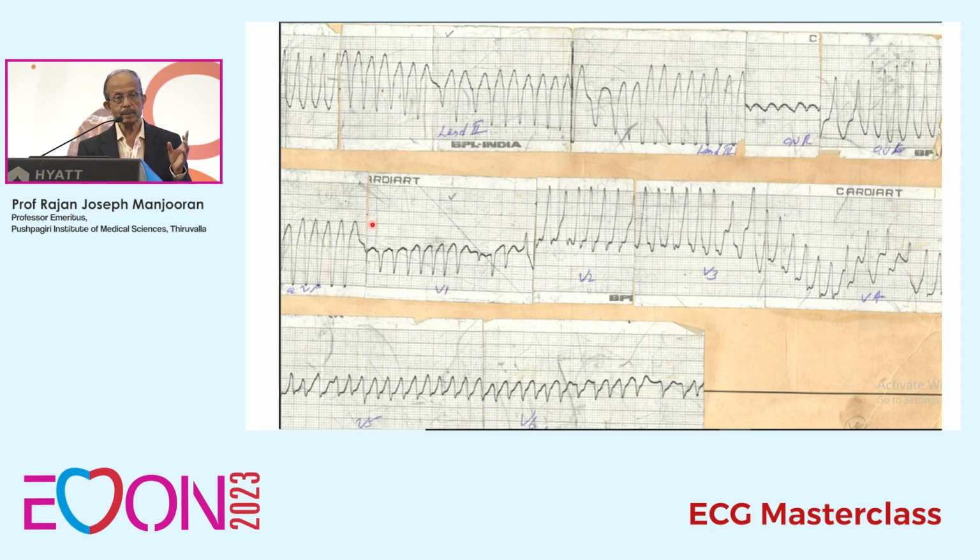But then the patient is having a variety of QRS morphology. Broad, narrow, intermediate. What is the basic situation where in a patient with atrial fibrillation you can have this type of a morphology associated with WPW. So this is a patient with WPW.